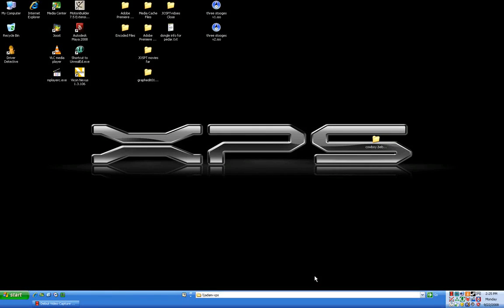Okay, so this is going to be a video tutorial on how to initially start up the Vicon database, as well as how to create the naming template skeleton within Vicon Nexus.